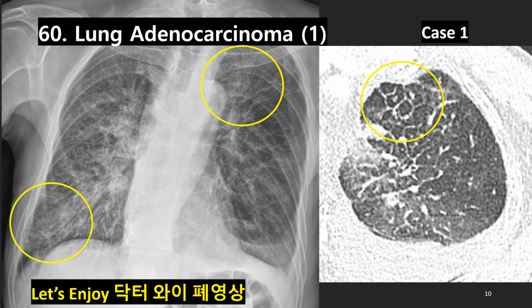We see septal wall thickening, prominent core structure in the lobule, arcade formation on left side, of course, also with pleural effusion on both sides.